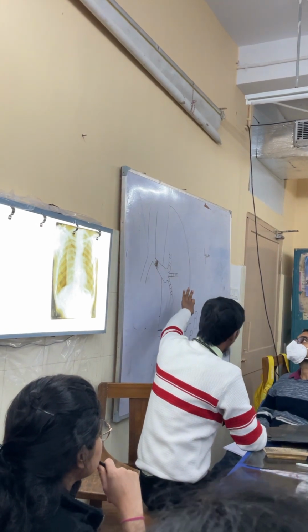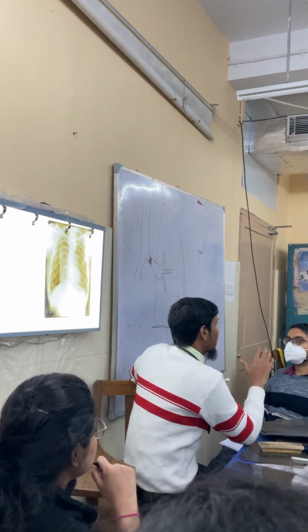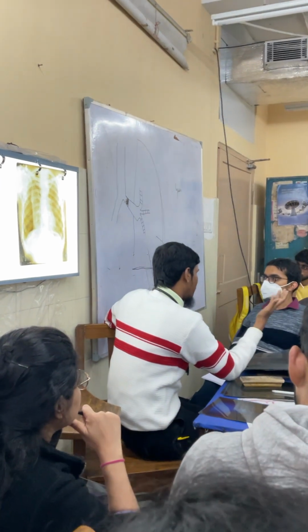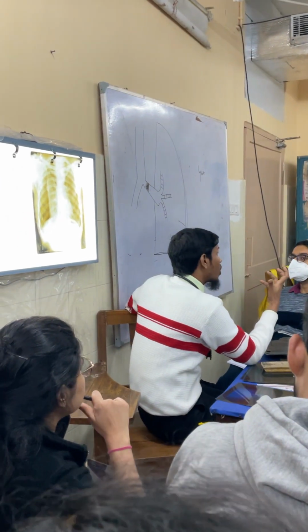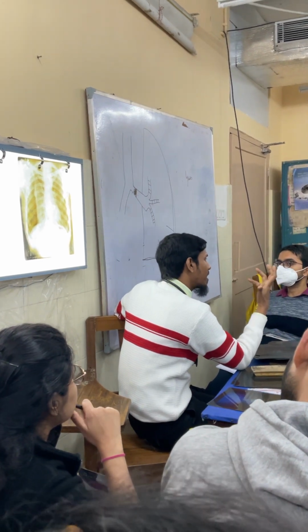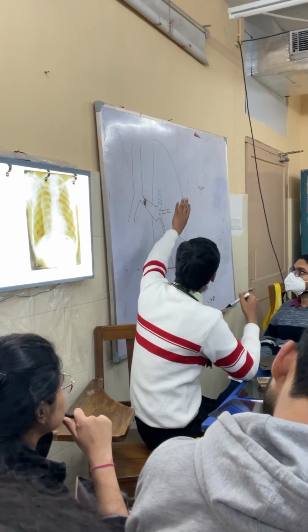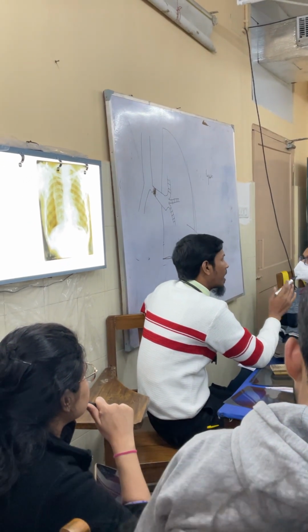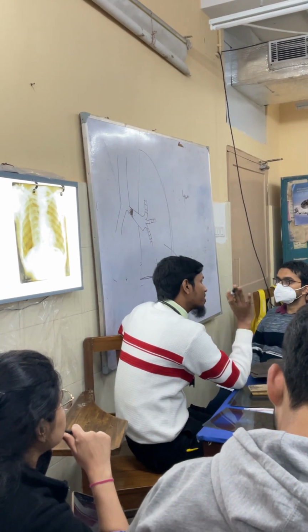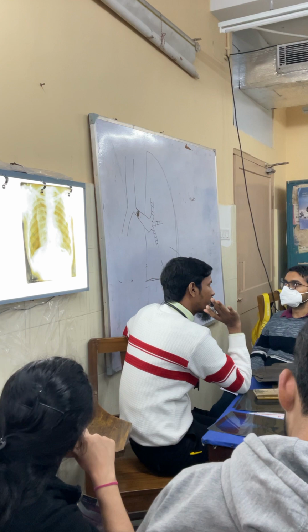So in this entire lung, the air present after 1 month or after 2 weeks also gets absorbed, and the entire part will collapse, and you will see it as a radio-opaque structure here.